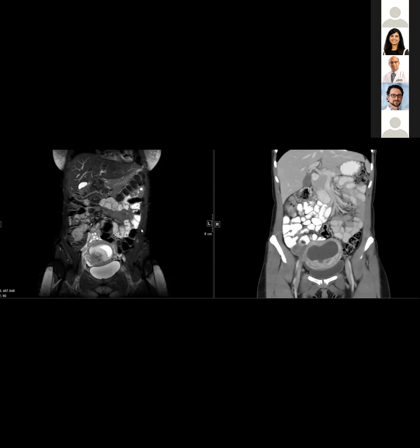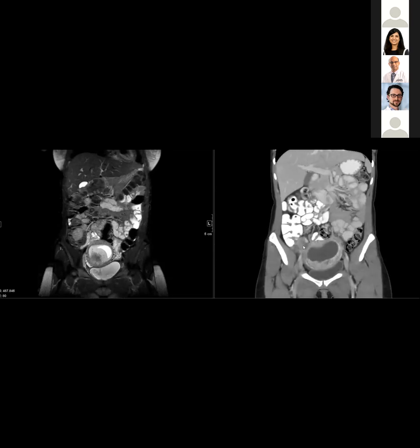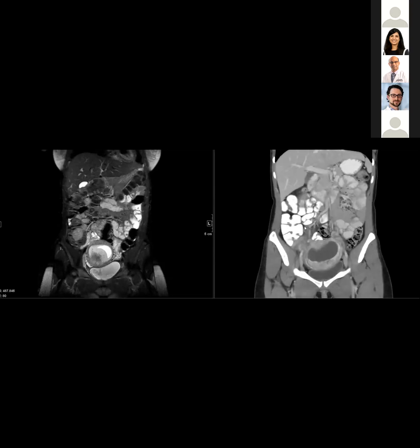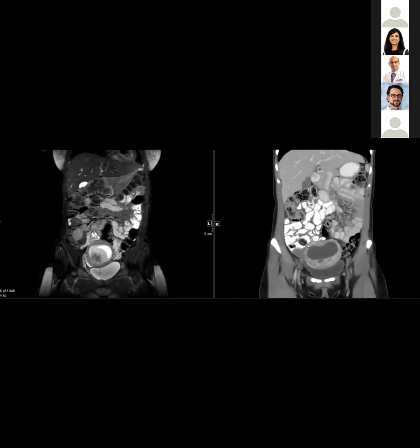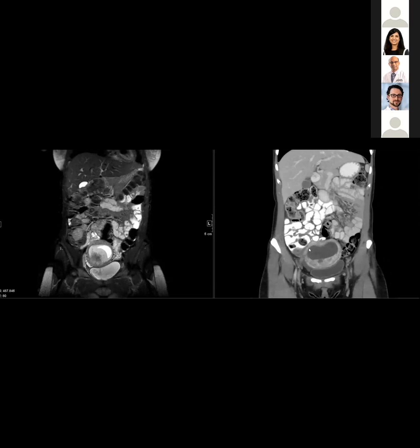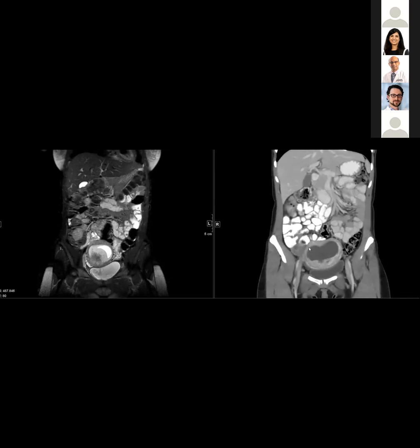Yeah, I guess that's what I'm saying. I don't think the gonadal vein is thrombosed there. I think that it's just not filling completely because the gonadal vein is draining from the ovary on that side mostly, right? Right, but there's really no twisting at this point, right here, right? I don't know. The ovary looks suspicious for torsion, for sure. I mean, the location is one thing, but also it's edematous and doesn't look good. So then that ovary is not going to be draining blood into that vein as well. You know what I mean? Right. So then there's unopacified blood going through there is my sense.